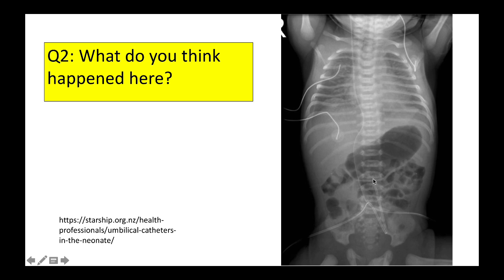And then what about this UAC? It looks like it's nowhere near deep enough. So you can see it goes down and then back up again, but it's sitting right here at probably T12, L1, L2, L3, so kind of the low-lying UAC positions.